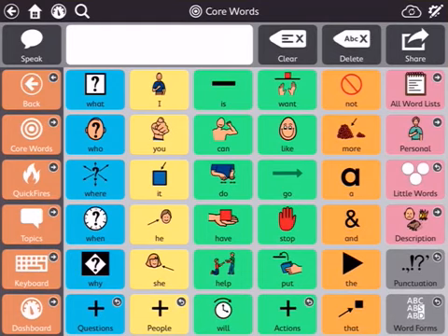So I'll just go into it a little bit. You can also change the grid size, which I'll show you in a little bit, but you push buttons to be able to talk, but you can formulate your sentence first, or it can talk on command as you type in the words. It's just a setting change that you do.